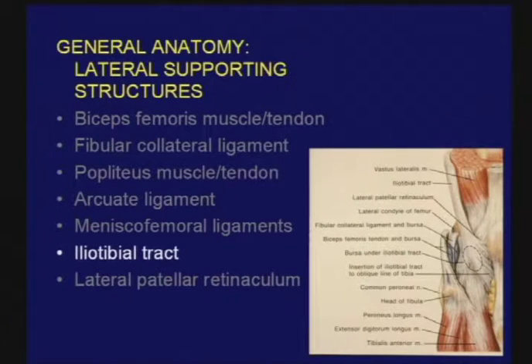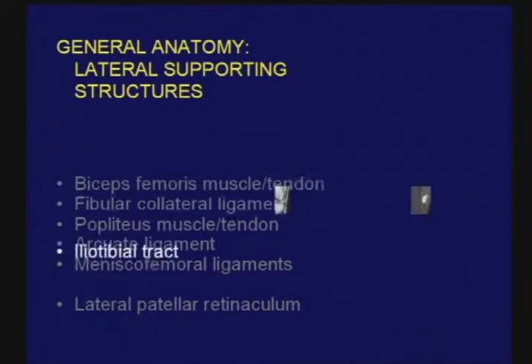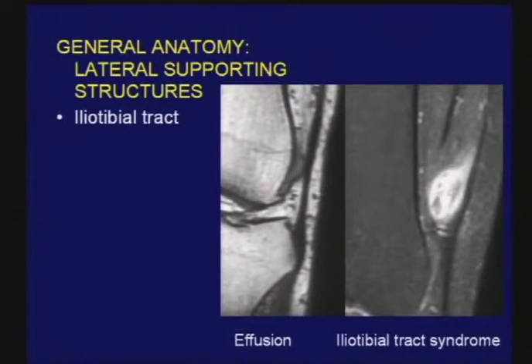The iliotibial tract extends along the lateral aspect of the thigh and has complex attachments at the level of the knee. The major attachment is to Gerdy's tubercle, and Minnie will talk about injuries to Gerdy's tubercle. When looking at that iliotibial tract, it's a nice place to look for abnormal collections of fluid.